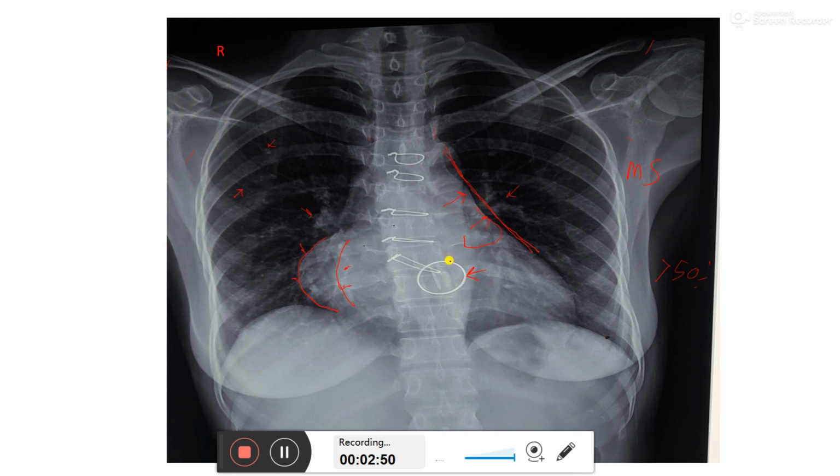And here you can see the mitral valve place, and here a ring is there, meaning mitral valve prosthesis. Mitral valve replacement has been done, and the mitral valve is replaced. This mitral valve prosthesis is implanted, and these rings.